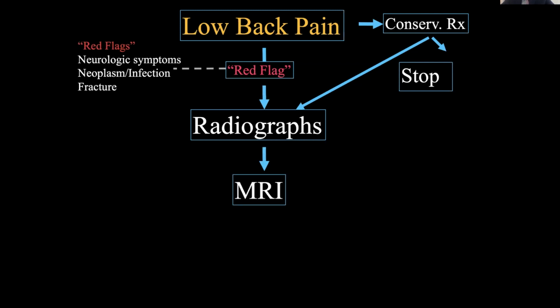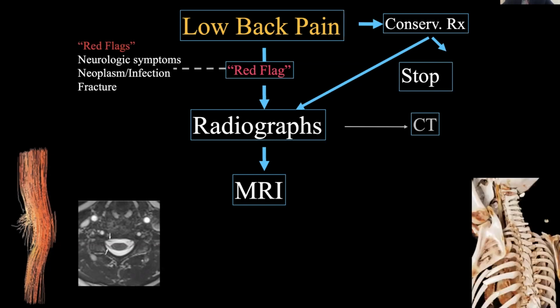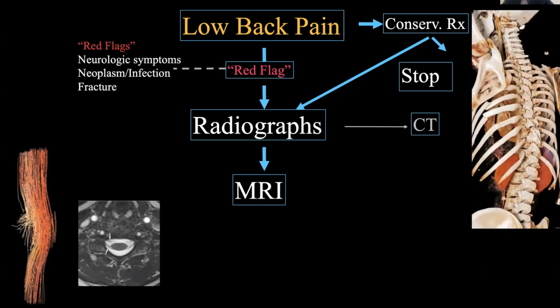And really, MRI is our workhorse, and this is synergistic with CT. So as you all probably know by now, CT and MRI have complementary features and give us complementary information.